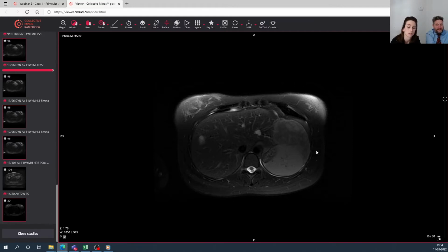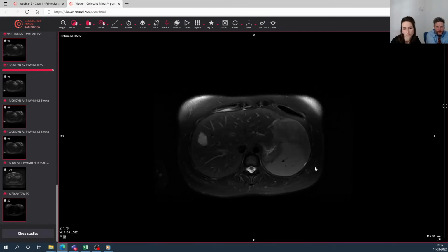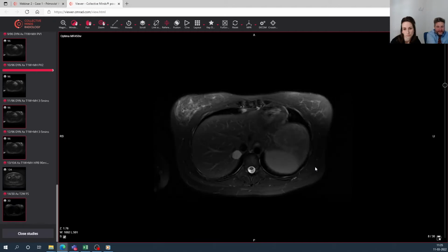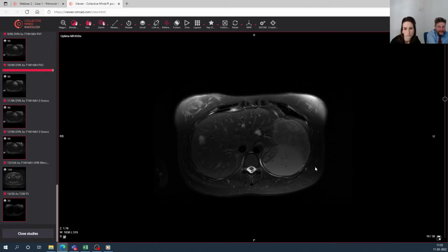Inflammatory adenoma, yes. And how is this sign called? The atoll sign. It's a hyperintense band, and you can have some hyperintense islands in the center. So this is a quite straightforward diagnosis of an inflammatory adenoma, with gradual hyperenhancement in the delayed phase, the 3 to 5 minutes phase, and a very specific pattern on T2.